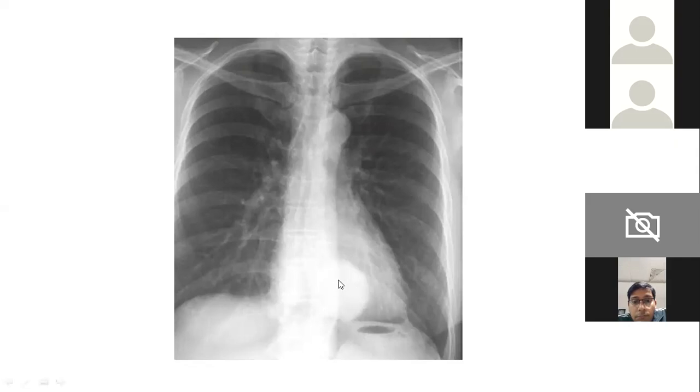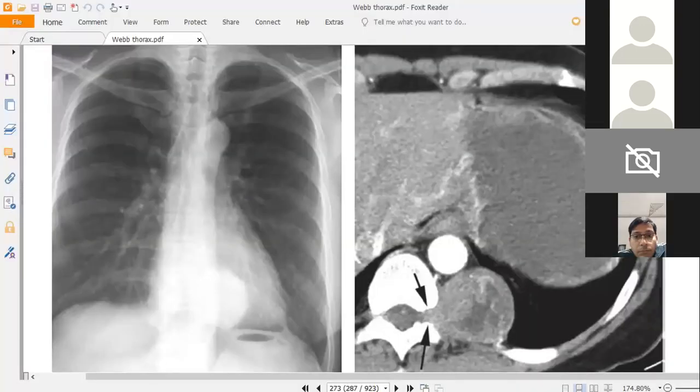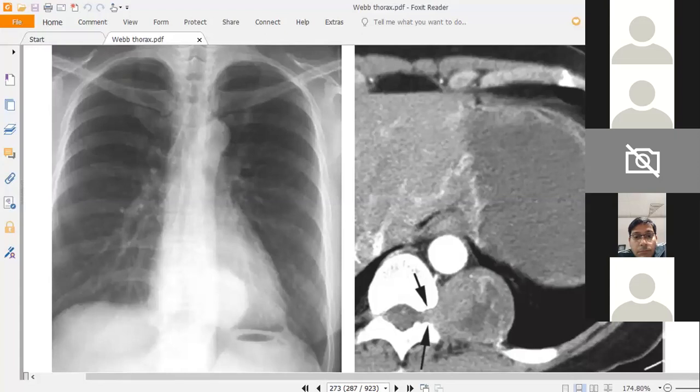Okay, so this is the para-aortic line, which is not getting silhouetted. So it is not in the plane of the descending thoracic aorta, which is a part of the middle mediastinum according to Felson's. So this goes into the posterior mediastinum. So we can easily localize which mediastinum just based on the silhouette signs, right? So this is what it was. It was a case of, again, a nerve sheath tumor in an adult.